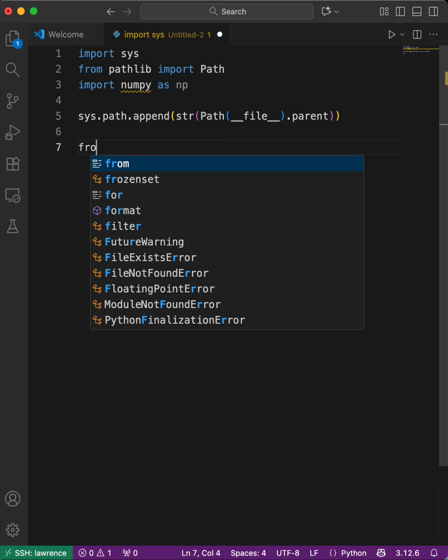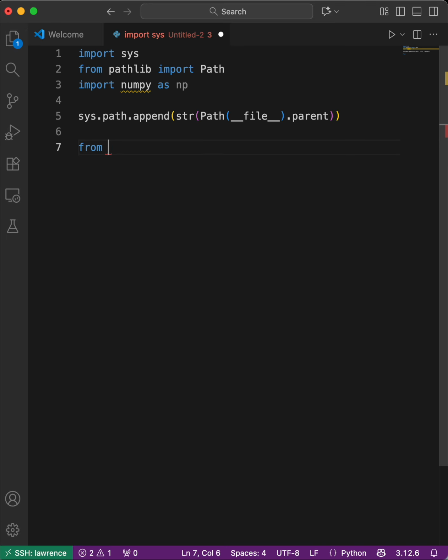Then I import. I have installed OpenTPS on a server with 28 cores. OpenTPS is a method to calculate dose using the Monte Carlo engine known as MCsquare.